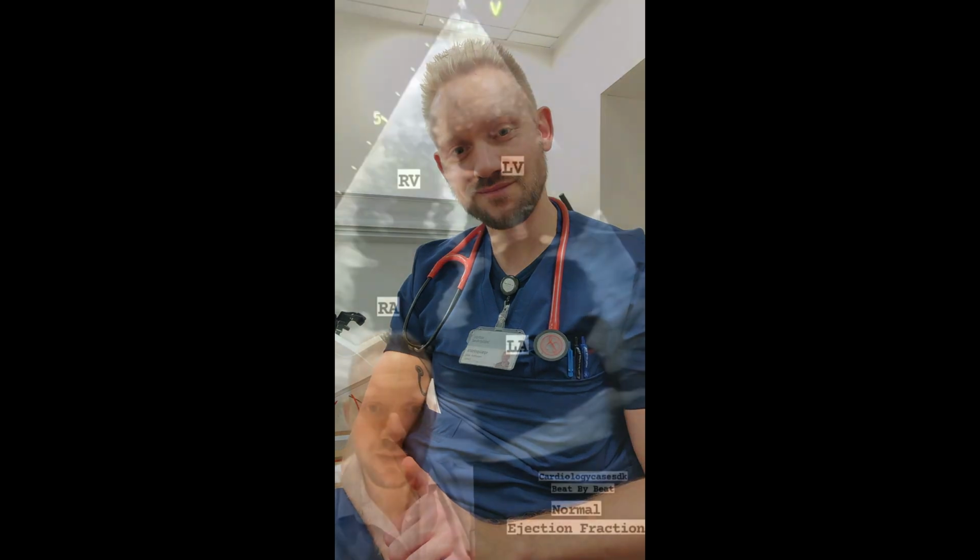Hello everyone, my name is Simon. I'm a Danish cardiologist, and I'm happy to inform you about atrial fibrillation here in September together with my colleagues. And I'm going to show you what most commonly you see on the echo of this type of patient.